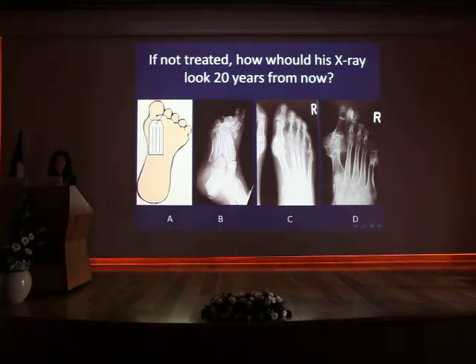And what's the main pathology on the third one? Psoriatic. We see erosion on the distal phalanx, on the interphalangeal joint of the first toe. And it could be, of course, psoriatic. I think it's mostly psoriatic arthritis, but the sign that it is psoriatic is here. You see the telescoping of the metatarsus, and that's probably psoriatic arthritis.